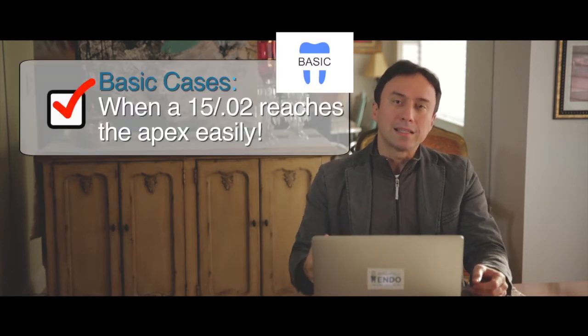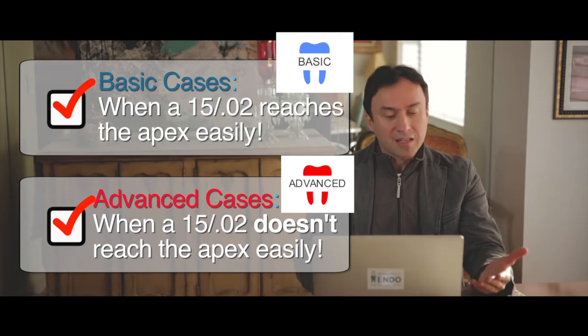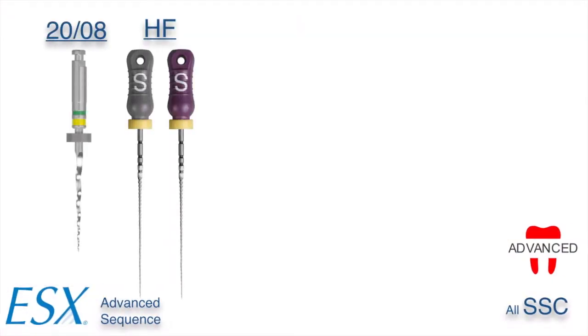In cases where you have difficulty getting the 15/02 hand file down to the apex, you would need to use the advanced protocol. The advanced protocol is basically a series of orifice opener files. You have the 20/08 ESX orifice opener, along with the stainless steel stiff files, sizes 8 and 10 in the Control Flex system. Again, these are also Brasseler hand files. They are a little bit stiffer on the sizes 8 and 10, which allows you to gain vertical length.